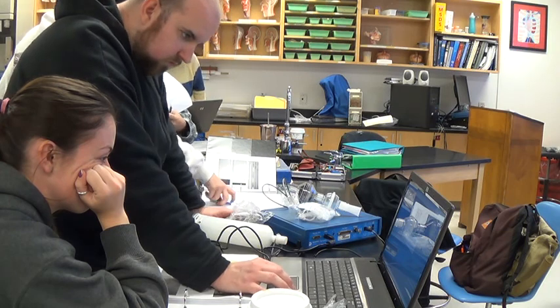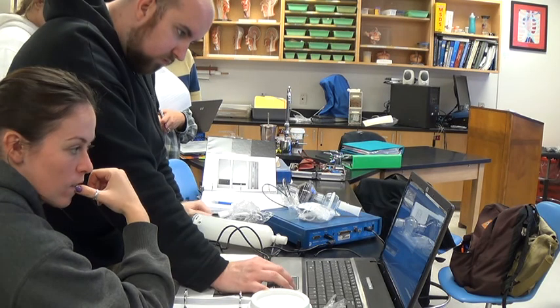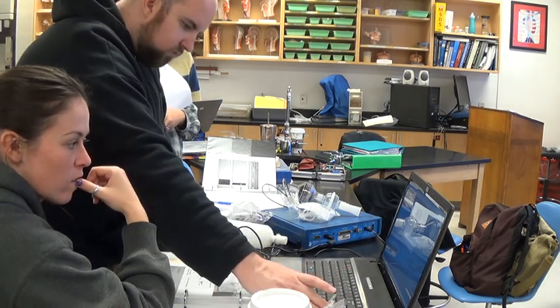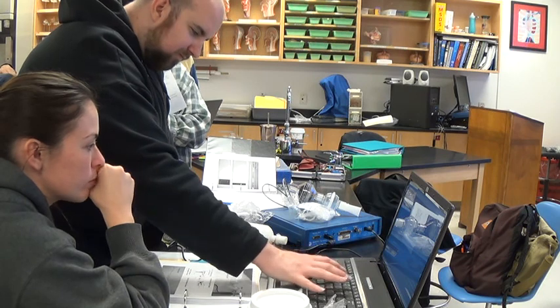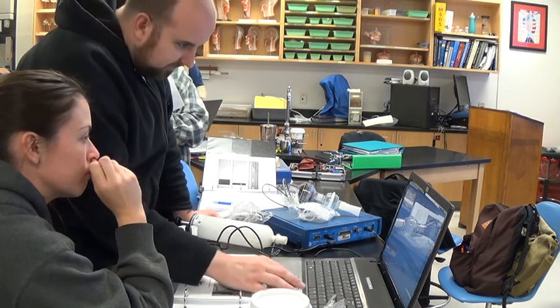Wait, no? It says as close to 1 second. You need to start at the very bottom. Oh, okay. So yeah, what you're going to do is read this. I'm going to come over here. It says highlight from the peak of the maximum towards the top.